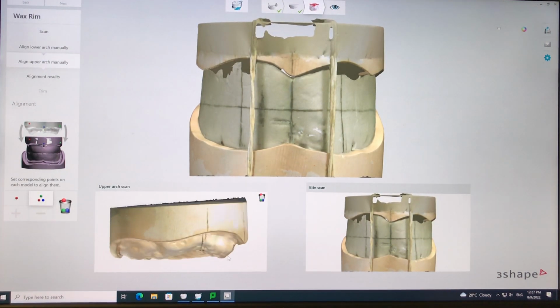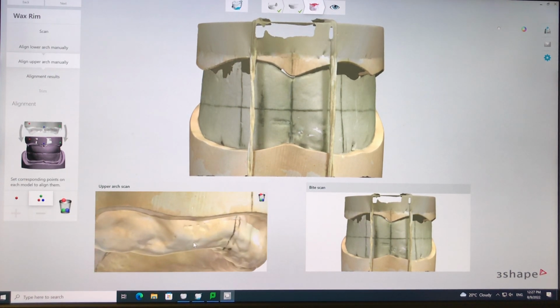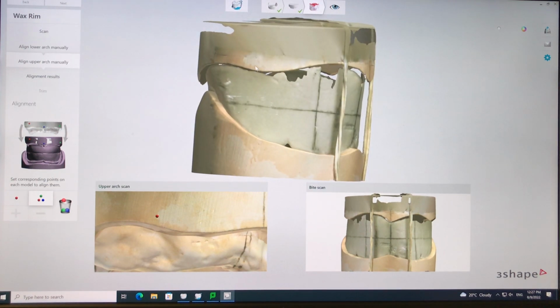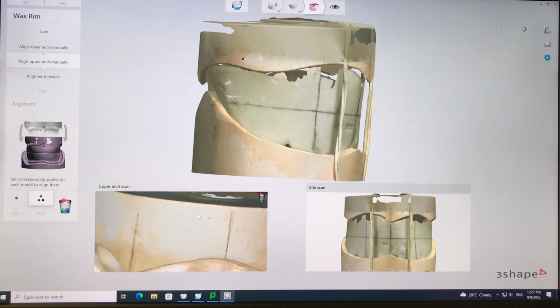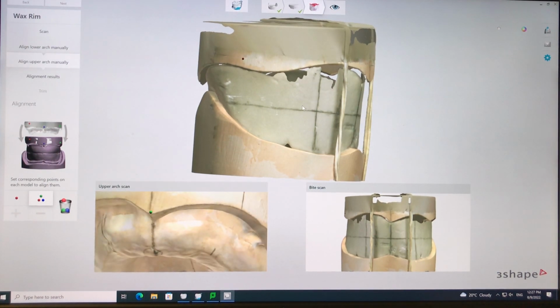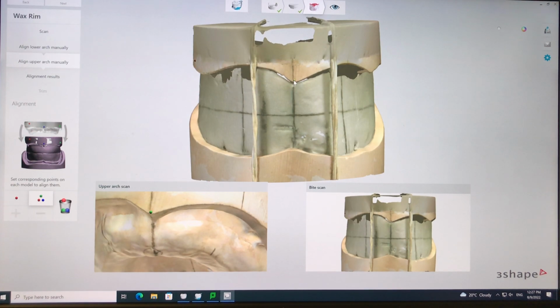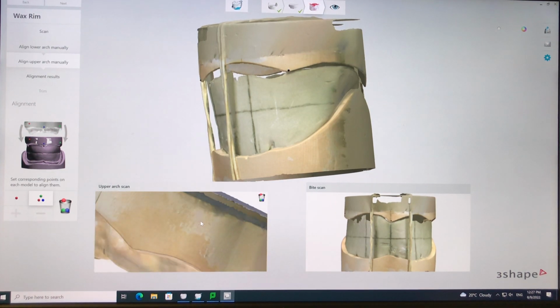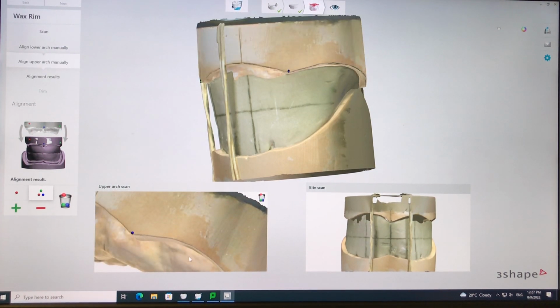Very simple. So I'm going to rotate it here again. I'm going to zoom in, bring this down a bit, pick a little spot here, see if I can find that same spot here. If you can't find that same spot there, all you have to do is just trash, start all over again. So there and there, rotate. I'll pick one right at the tip here. That's pretty obvious, right there. And then I'll rotate it here, and I'll pick one right at this corner, rotate right there. So let's just see how close we came.